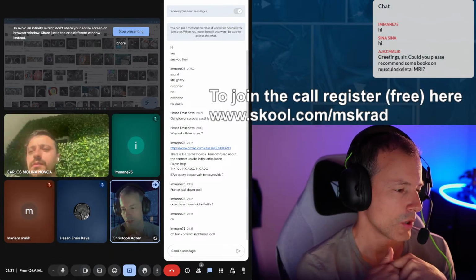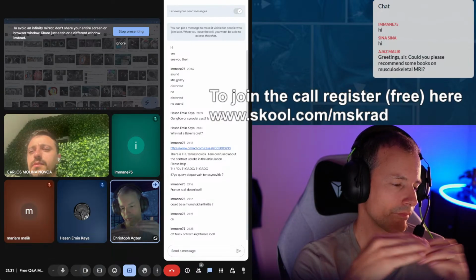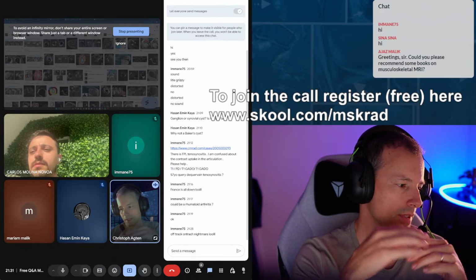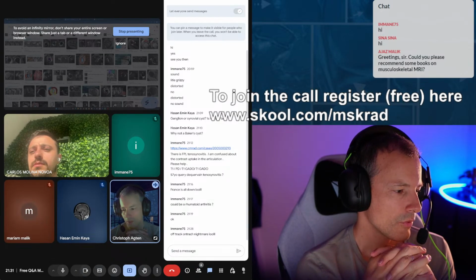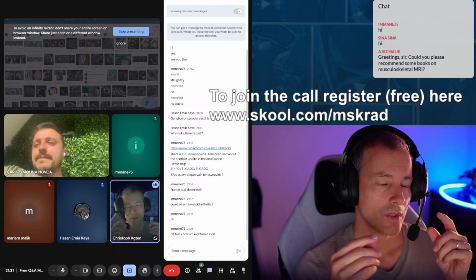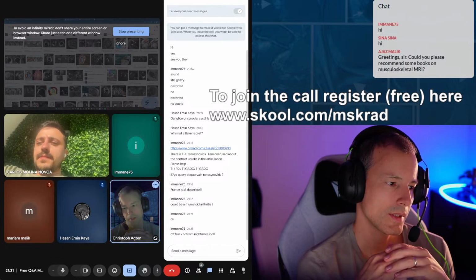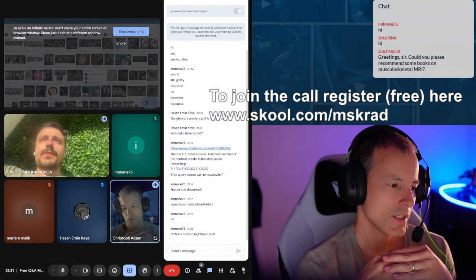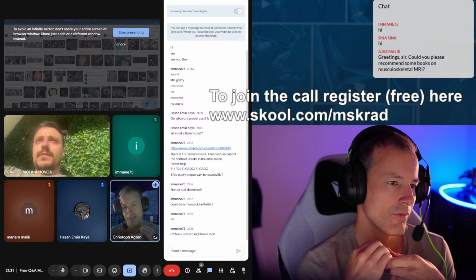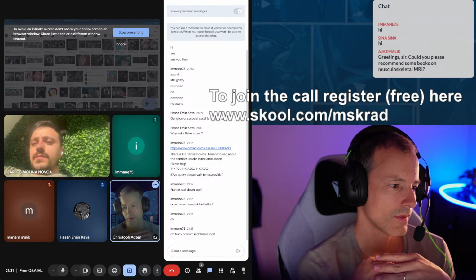Reactive edema will also enhance. There will be kind of a zone of transition. It's not just a sharp line. So obviously there can be some form of progression, but if the T1 signal is not the same as muscle or below, I would not call osteomyelitis. This is a very strict rule I follow. And the rest, when I see edema go beyond that, I just call it reactive marrow edema or bone marrow edema.